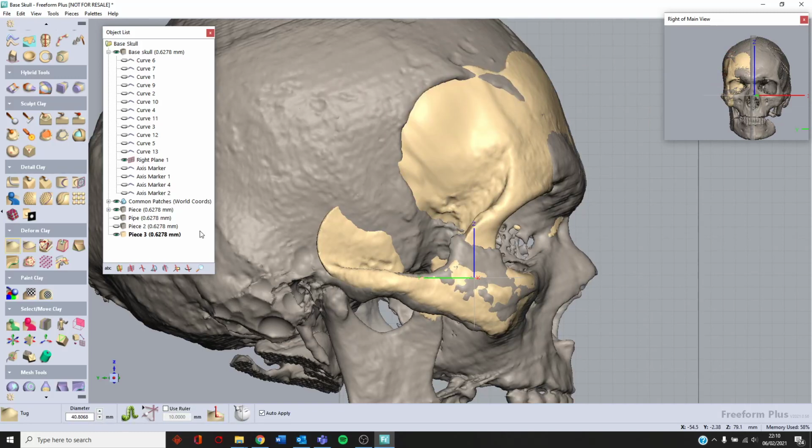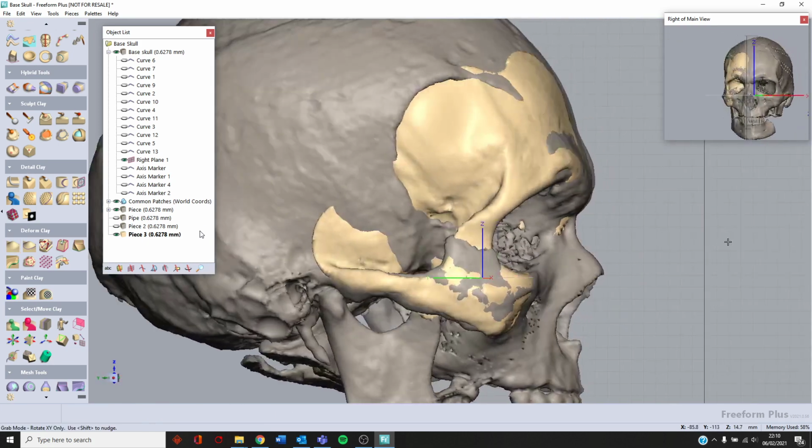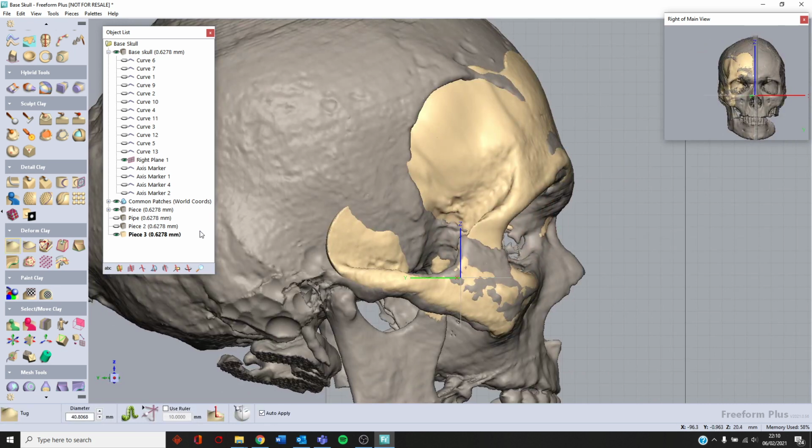So once the main defect is selected, I will go down and adjust the smaller area, and then to the top here as well. Also keeping patient aesthetics in mind. I can do probably with a little bit more changing as well. And then that area is completely not needed, so we can get rid of it by selecting it.